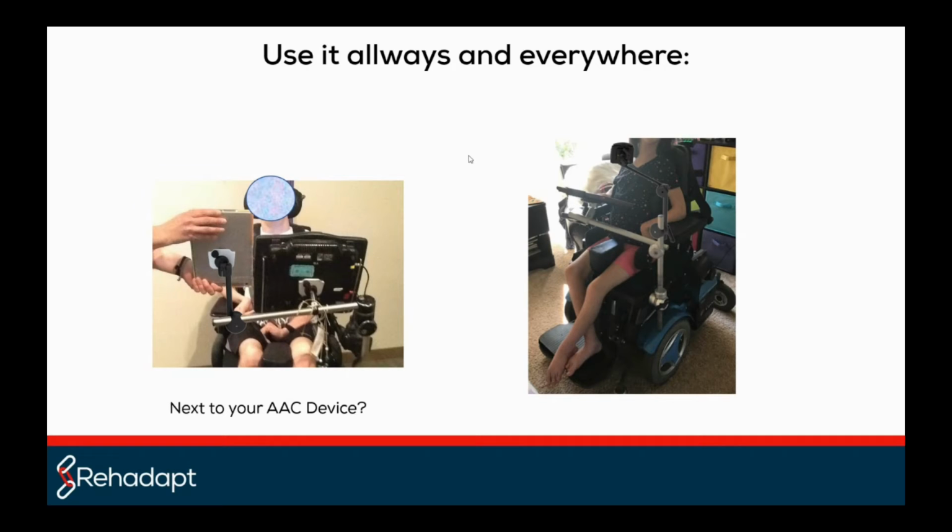Also, we provide these light mounting solutions L3D that we are calling for maybe even when there is not the demand for such a high loading that you apply to the mounting bracket, which can also be applied to the wheelchair mount and to the wheelchair within a second and can position the communication device.